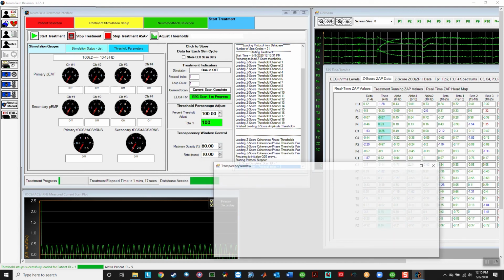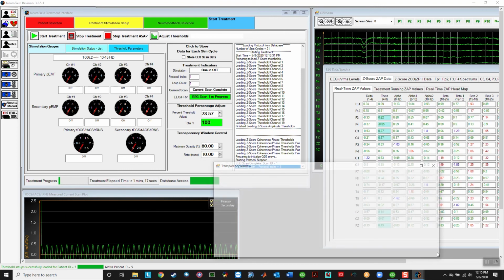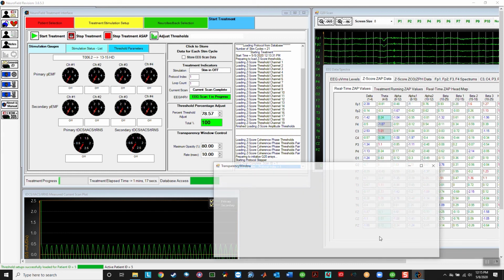We can lower the difficulty level, and you can see the window start to change in real time. If we increase this number, it becomes more difficult to keep it clear. Again, this is a real fast response time. It works very well with a number of different things like YouTube or Netflix or Amazon Prime, whatever you want to watch. You can put it up there, or just have regular MPEG videos, like relaxation videos or stuff like that. They all work really well with this platform.